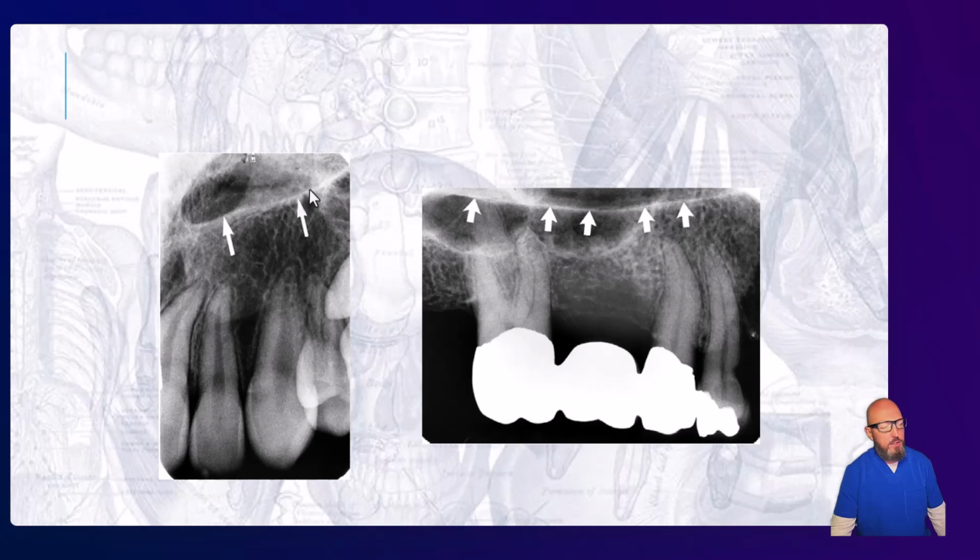So this one right here is really similar to what I just showed you. It's the anterior nasal aperture, the opening of the nasal cavity. Here we can see we're looking at a canine. But as you project further posteriorly, sometimes even in the posterior radiographs, you can see this straight line extending posterior. In this case, anterior is over here, posterior is over here.